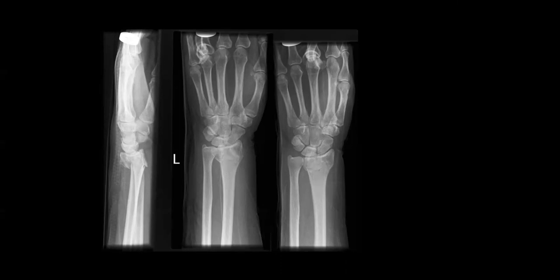Following this, you need to make a comment on angulation. So angulation refers to the way in which the fracture fragments are angled. And when referring to this, you always comment on the distal fracture fragment. So you describe the angulation of that in relation to the rest of the bones. So angulation in this case can either be dorsal or volar. I sort of remember it that volar sounds like palmar, i.e. pointing towards the palm, and therefore dorsal is the opposite. So if you look here, you can see that there's dorsal angulation of the distal fracture fragment, which is that characteristic dinner fork deformity that you always hear about with these type of fractures.